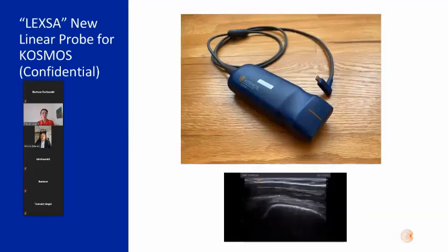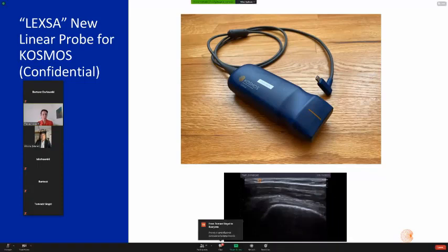So my last few slides are about the newest features. We're about to leave, very exciting. This is an image I only just received today. It's of the new linear transducer. So you'll have both the torso to image the lung, abdomen, and the heart, and now also the linear transducer for vascular, nerves, musculoskeletal, all the superficial imaging.